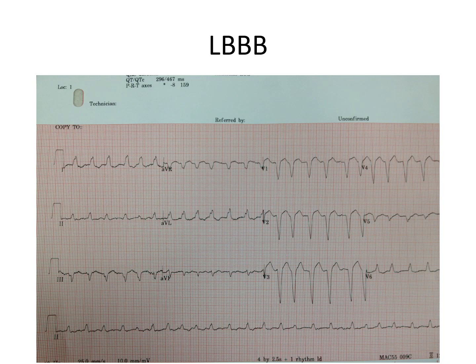This is an example of a left bundle. So if you look at the precordial leads, V1, V2, V3, V4, you can see that there are ST elevations there, right? The J point is elevated compared to the following T-P interval, which is a little bit tough to assess due to the irregularity and the fast heart rate, but it is elevated. However, it is appropriately discordant to the negative QRSs, and it is not excessive, which is to say the J point elevation is less than 20% of the height of the QRS, and therefore these are non-pathological.